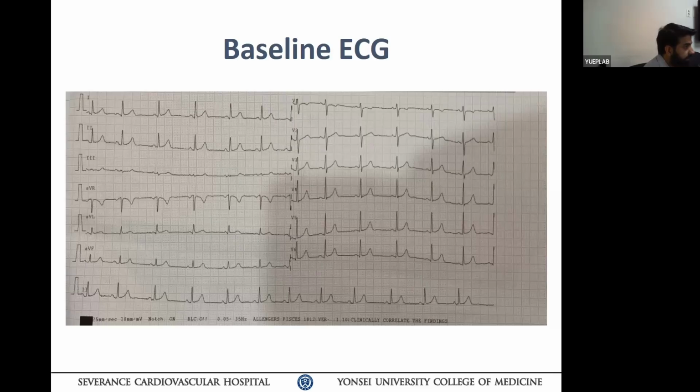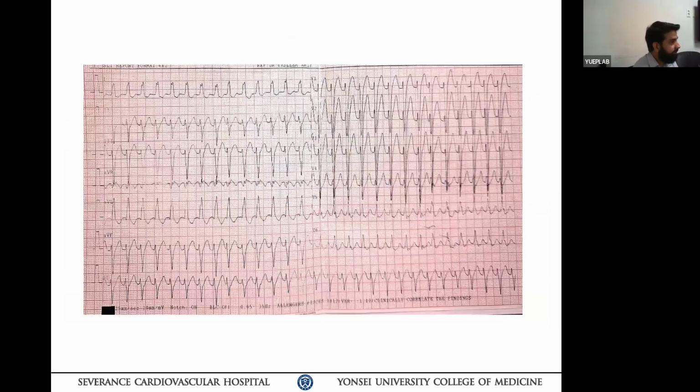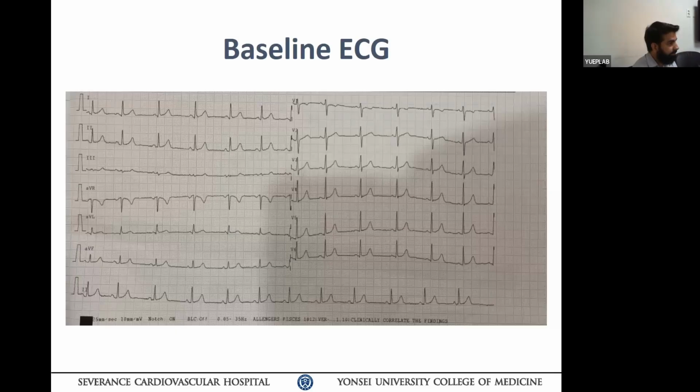So, like this minimal pre-excitation, you would like to revise the diagnosis with that? Well, yeah, SVT was my second differential, so I'll move it. I cannot say there's some abnormal finding, even though if we have a biased eye, there's a little minimal delta wave, but I cannot tell you it's absolutely abnormal.